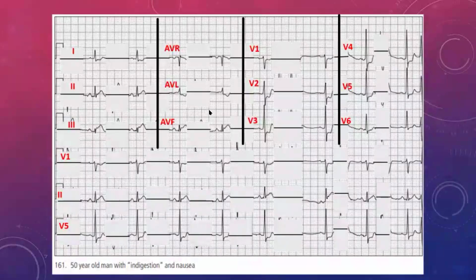So when you're dealing with a difficult, busy ECG that has a lot of changes and a lot of things going on, it's best to simplify, remove the things that you don't understand. And like I say, listen, if you're working in a hospital environment, they can afford a second printout or a third printout. It's fine. You can physically remove the things that you don't know on a spare printout. Or if you want to just place your finger, or even on a single part of it on the second printout, just remove pieces of it and try and analyze what you do see.